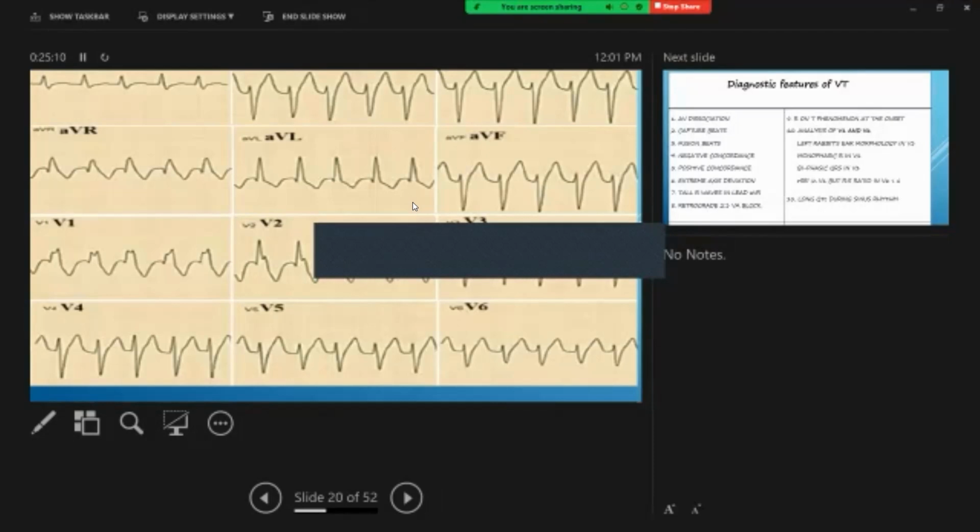Now this ECG shows again regular RR intervals, broad QRS complexes at a rate of 170 beats per minute. Regular broad complex tachycardia. Now it could be one of the examples as I discussed. Now let's go through the ECG. You can see the QRS complex, T wave and the baseline, QRS, T and baseline, the QRS complex, T and baseline. You can't see any atrial signals. So next, the possibilities are whether this is ventricular tachyarrhythmia or supraventricular tachycardia with one of the bundle branch block.